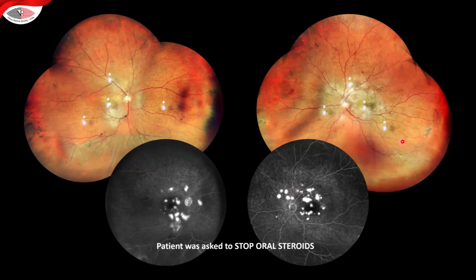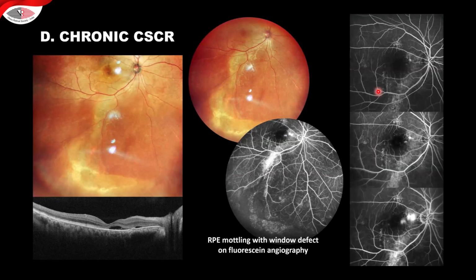This is again the same patient's wider pictures, and this patient was on steroids for a condition, and we asked the patient to stop the steroids, and eventually the leaks disappeared.